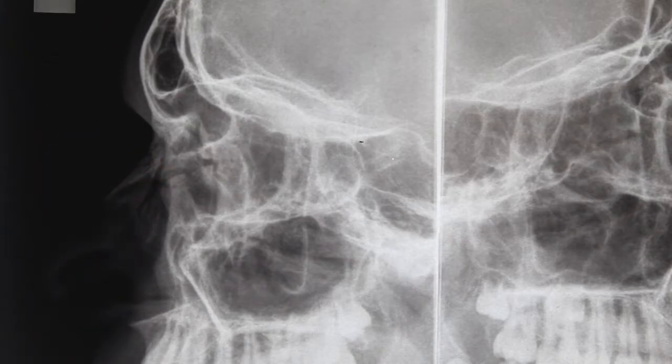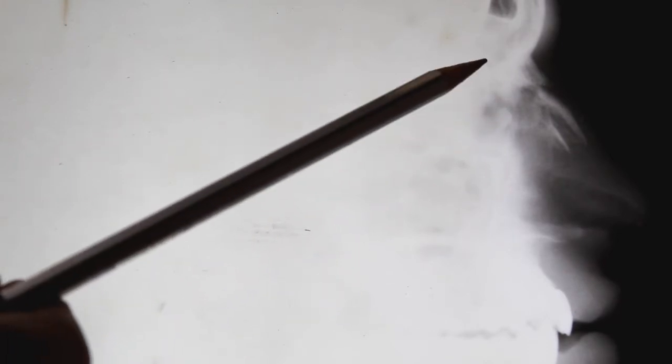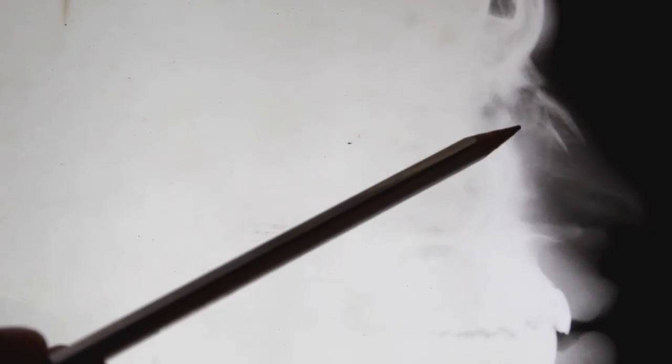Usually the students will mistake this groove as the fracture line, but this is a groove for ethmoid nerve and vessel, and that will run downwards and forwards. So this should not be mistaken for fracture line. Always you have to differentiate the fracture line from the groove for ethmoid nerve and vessel, which also runs downwards and forward. Here this is the groove for ethmoid nerve and vessel, and this is a different fracture line on right lateral view.